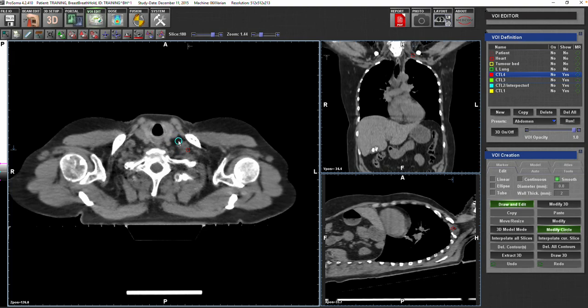So what the guidelines would tell you is that we will not be concerned about the artery, but we will just be concerned with the vein, and you just put your medial border of the delineation just around the jugular vein without a margin. When you see the target volume delineation, it will also tell something about the sternocleidomastoid muscles.